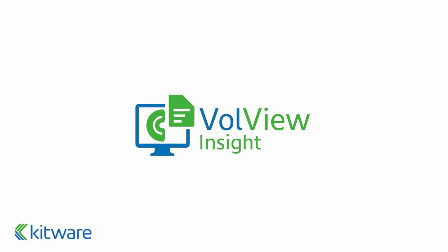What we've built is a robust and transparent foundation for creating clinic-ready applications. By handling the complex integration of data and analysis, VolView Insight allows clinicians and researchers to focus on what matters, leveraging multimodal data to improve patient care and advance medical research.